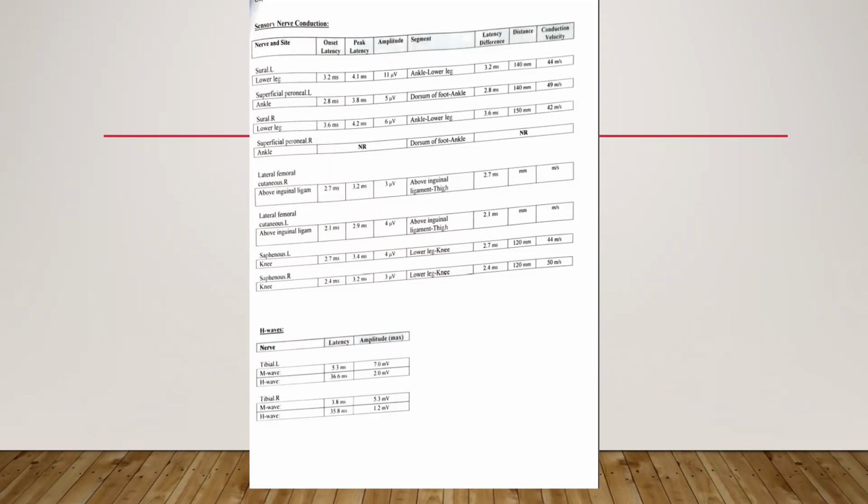It could be peroneal neuropathy at the fibular head. But you cannot give the localization, the site where it is affected, from just a nerve conduction study. Yes, it looks like peroneal neuropathy. Yeah, it is a common peroneal neuropathy.